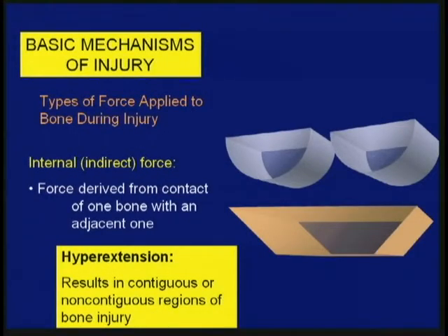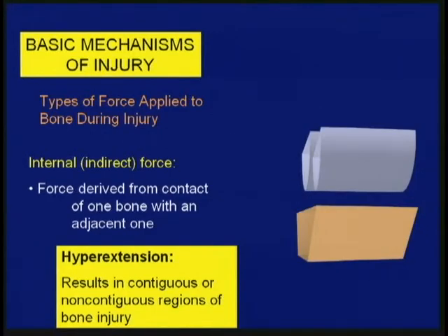We go to our fourth scenario of our five, and that is hyperextension. In order to understand what happens with hyperextension, we have to change from a frontal radiograph to a lateral radiograph. Easy to do in PowerPoint. You're now looking at a lateral radiograph of the knee, femur and its condyles above, tibia below. The typical, although not invariable, scenario with a hyperextension injury is a force applied to the anterior aspect of the knee. That's the external force. You may see it as soft tissue edema or marrow edema on the surface of the bone. This will throw the knee into hyperextension.